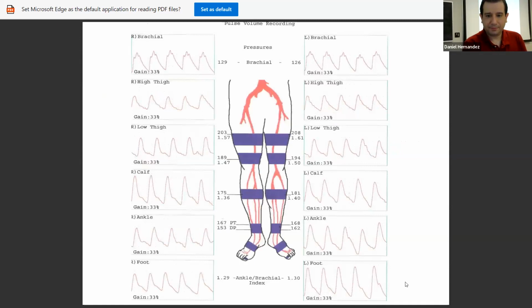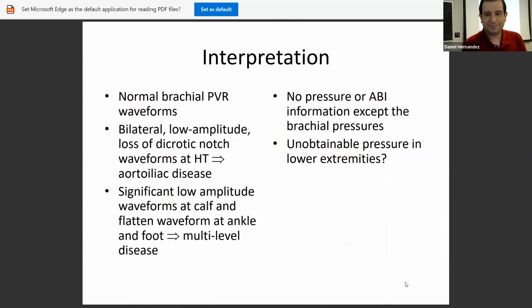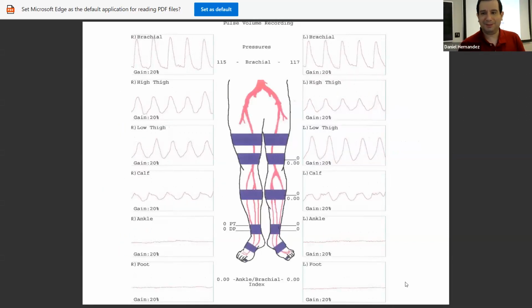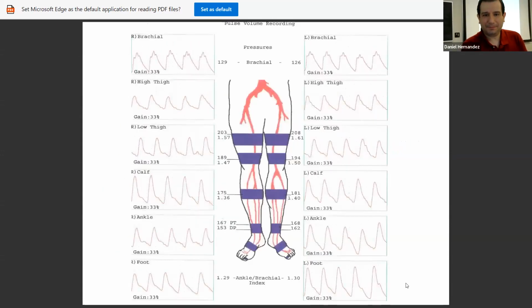Is that an anacrotic notch? Kind of looks like it's flipped. I'm talking about that one. We went to the next one. Yeah, looks like it. It's very obvious, not just a little bit like the one example that we had, which was a tiny little one. It definitely looks like a peak waveform, absolutely. Right on.